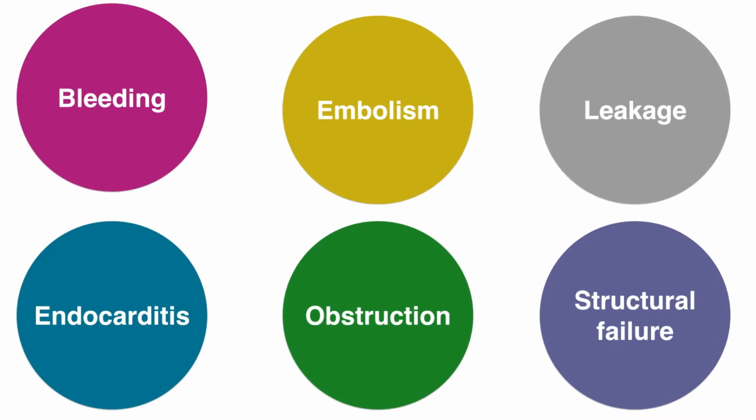As you heard in the previous chapter, you will encounter prosthetic valves very frequently in your daily clinical routine. Even more so, it's important to pick up if there is a problem. So let us now go back to echo and look at how we can detect if something is wrong. Just as a review, this is what we are looking for.